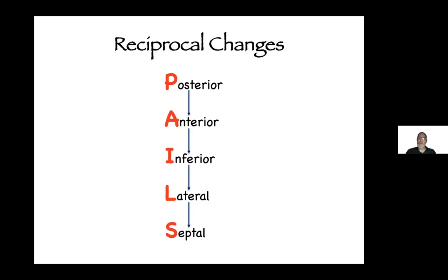That's why inferior MIs are what a lot of people call the bunny slope of MI recognition, because the pattern is so predictable. But just because the patient doesn't have reciprocal changes does not mean they're an automatic rule out. To me, that simply makes a difference between a layup diagnosis and a slam dunk diagnosis, right? If they have ST elevation that's contiguous with chest pain, then I call that a layup diagnosis. But if they have ST elevation with chest pain with reciprocal changes, that's a slam dunk diagnosis. So that's the way I look at it. Take what you will from that.